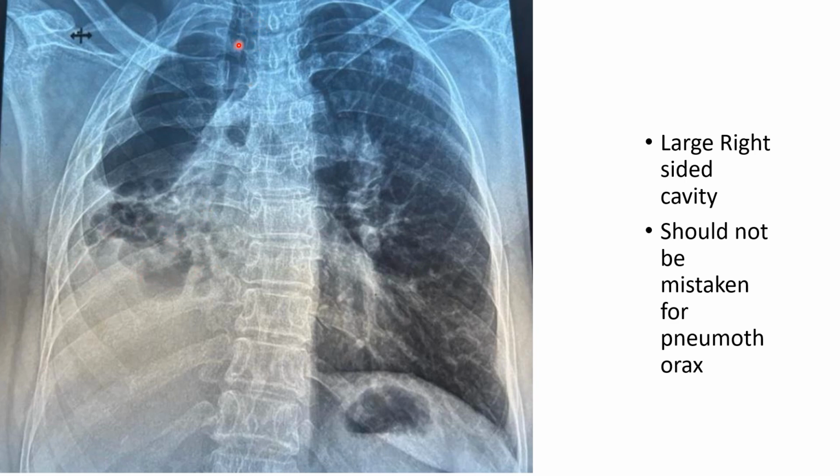Surrounding this there is fibrosis, ectasis, and other structures, right? The trachea is shifted to the left side, and the mediastinum is shifted to the left side, because the cardiac shadow is supposed to be here. The apex is somewhere here, but all this is shifted to this side, and there is gross volume reduction, and there is a scoliosis of spine. So this is a large cavity.